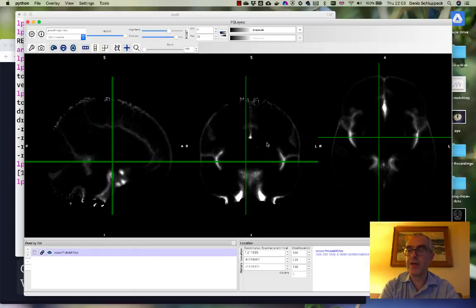that there's certain assumptions built into doing this registration. So in particular, if you use an affine transformation, you assume that in order to get from one brain to another, all the spatial transformations you need to do are affine transforms.